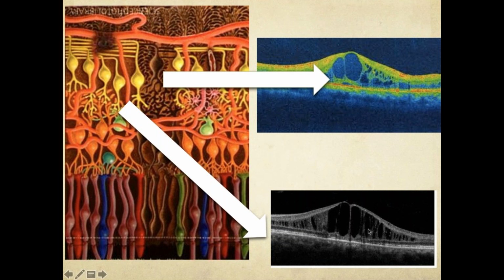So the difference between this retina and this retina is that if you do a visual field, in this retina, due to the vertical splitting, the wires are not completely cut. There will be some relative scotoma, right? But here, since the splitting is horizontal, all the wires are cut. So there is no connection between this layer and the inner layers, and hence this eye will have a complete, absolute scotoma, while this eye will only have a relative scotoma.